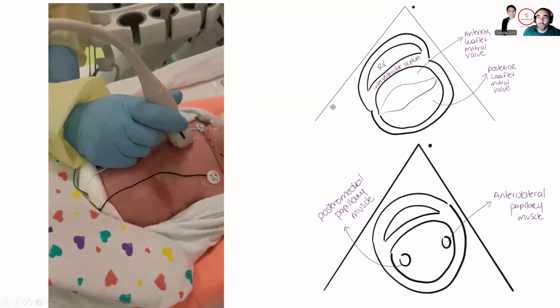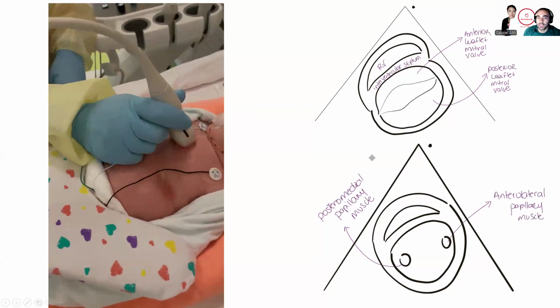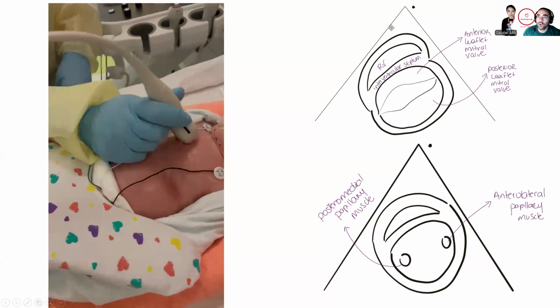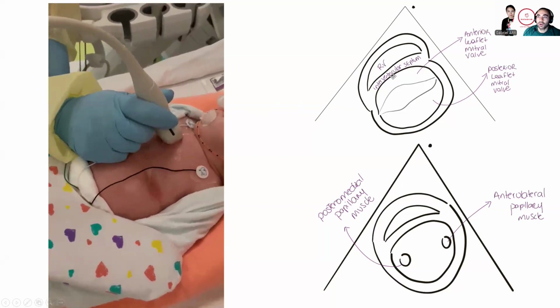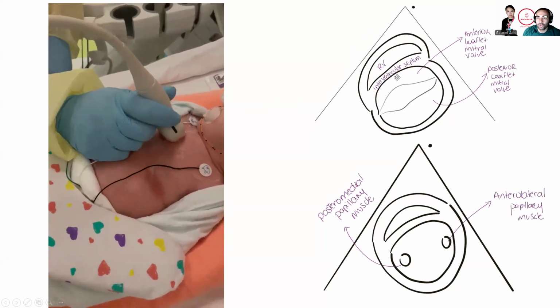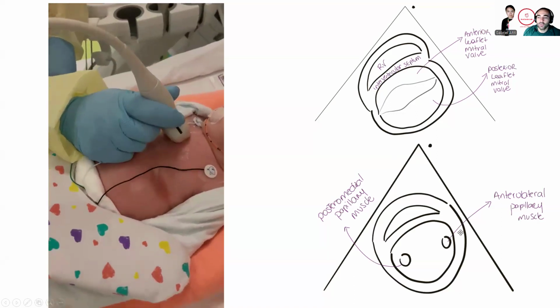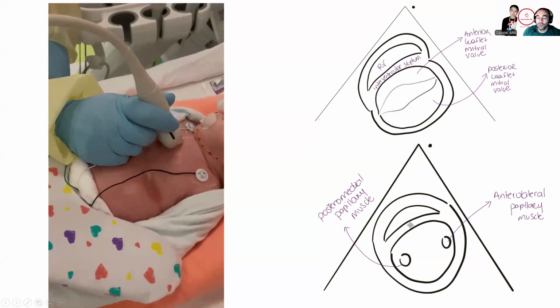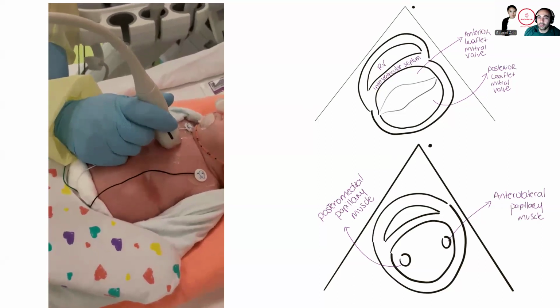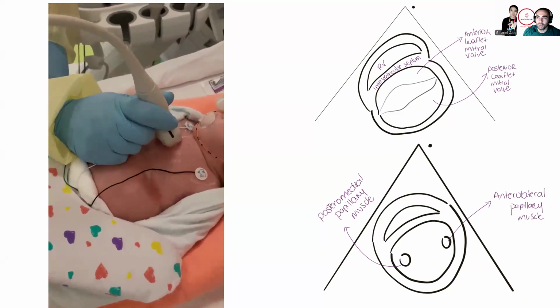And so in these images, what we're going to appreciate, obviously, again, is the cardiac function. It's a good view to sometimes detect a pericardial effusion, although the best view is typically the subcostal one. You'll also have a sense of the relationship between the RV and the LV, and really the short axis images, either obtained from the parasternal views or the short axis of the subcostal view, are typically the only ones where you can appreciate what we call the septal motion. Don't try to get an estimate of PA pressure relative to LV pressure from an apical view. It's not good practice, and it will misinform your evaluation.